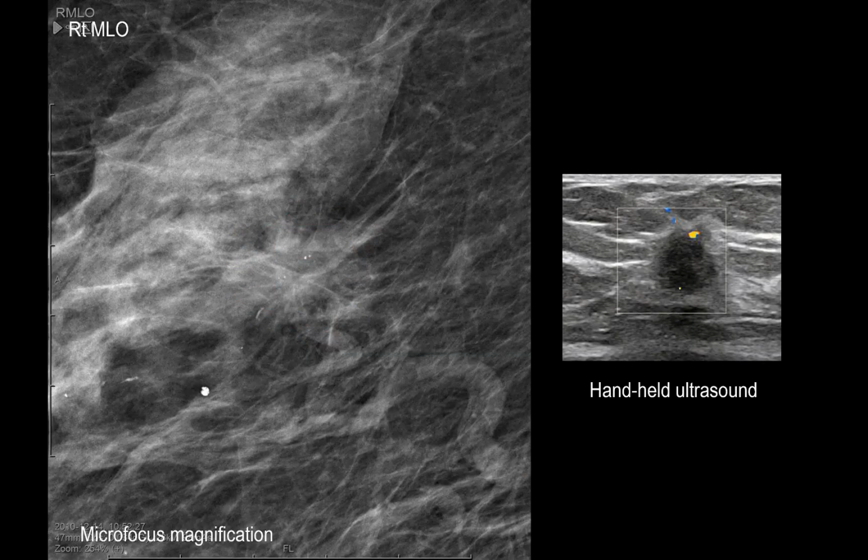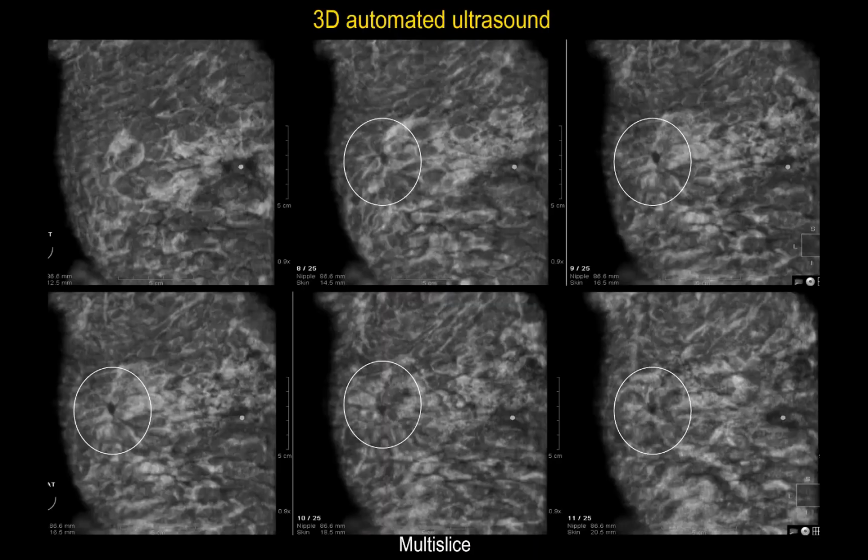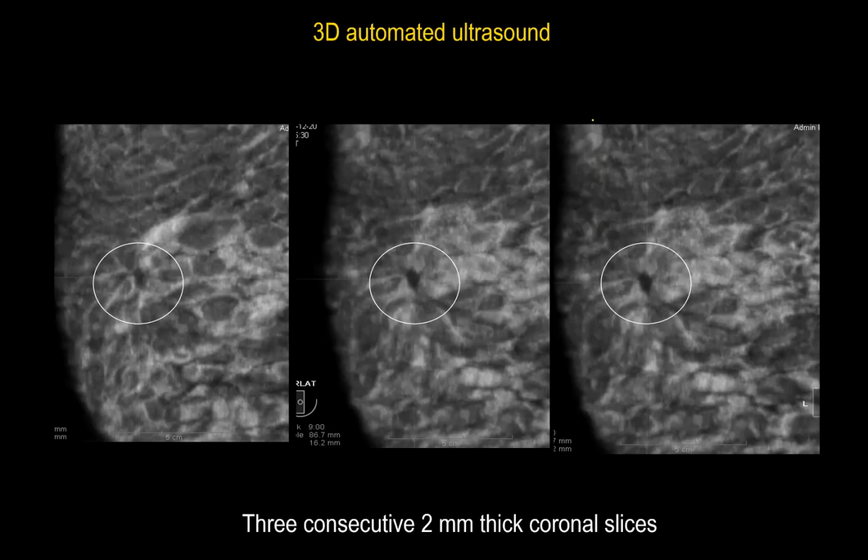Of course, ultrasound could find it. Easy. You see how difficult it is? And if 8 or 9 radiologists sitting here out of 10 missed it, then there is no problem with the radiologist. So we need help. Look at this. Even a child can find the cancer if you do automated breast ultrasound. That's going to be the future. We are not going to miss these cancers.